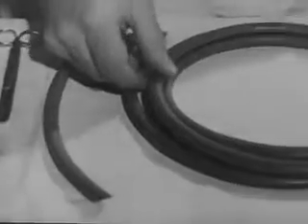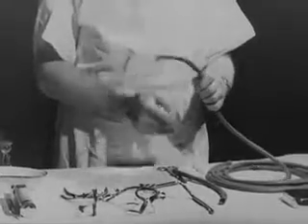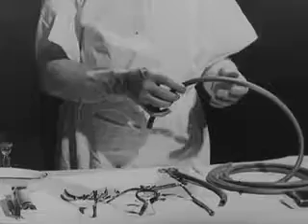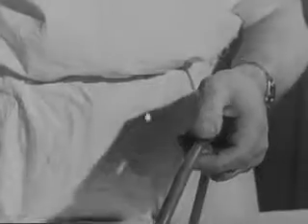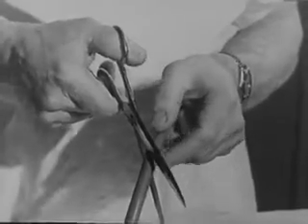Now for the endotracheal tubes. These are made from ordinary commercial rubber tubing, which is stored in coils, so that its natural curve is readily adaptable to the course of the air passages. This material differs from drainage tubing in being firmer in consistency and less liable to collapse on external pressure. To make an endotracheal tube is a simple matter. First, cut off a length of the tubing at an angle of about 45 degrees.